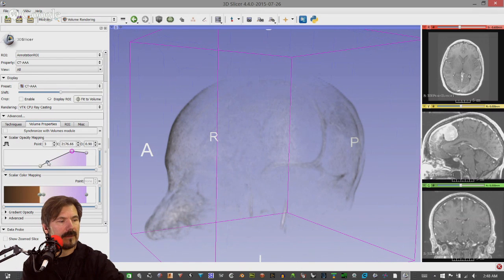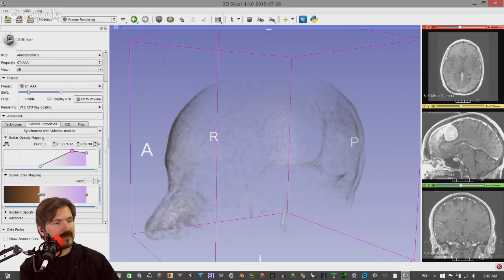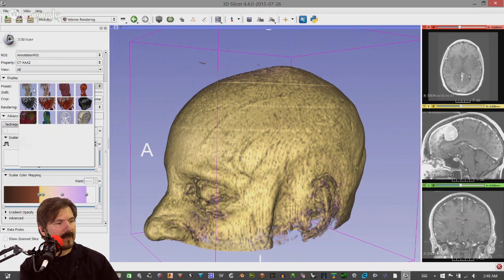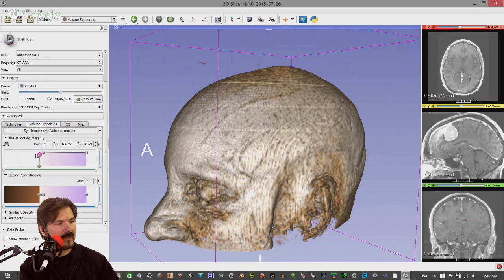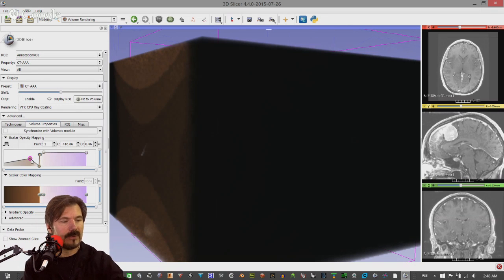Is there any way to reset it back to the kind of standard if you, let's say? Well, you can always go back to one of these and you can create your own preset. So let's go back to this. Yeah, call me a liar. There we go. And so we can always go back to one of the presets you start with. So see, notice I just grabbed the wrong one again.